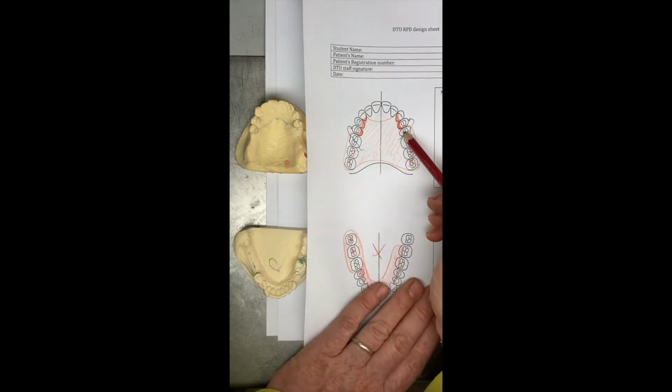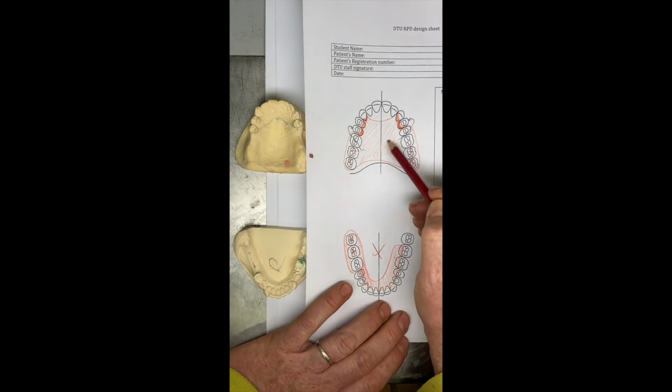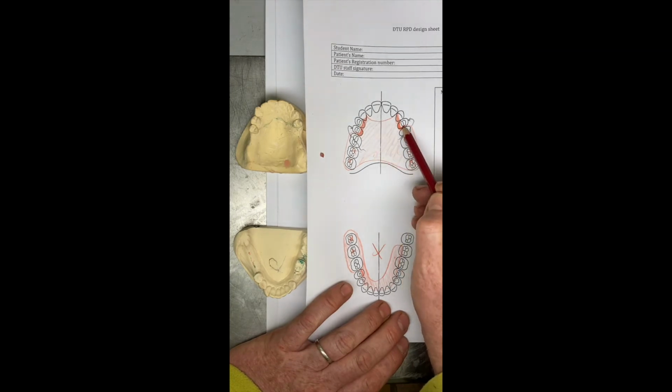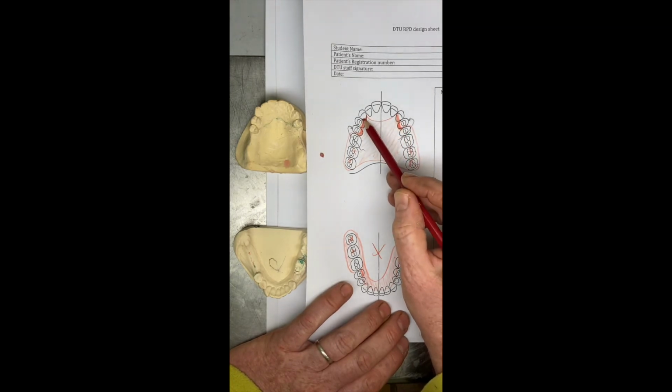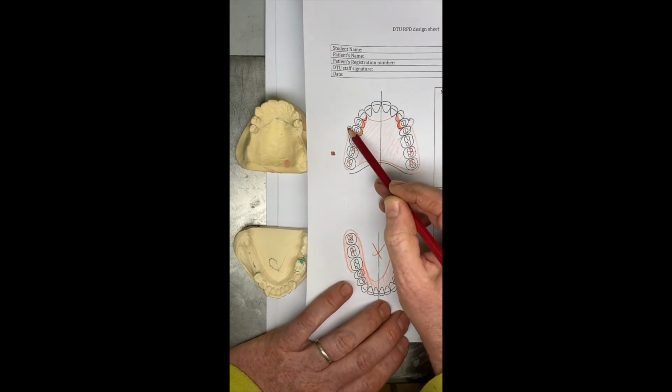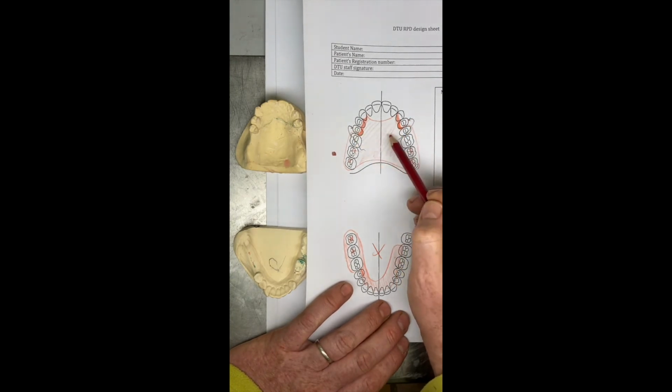The differences really are that the support would be gained from the footprint of the denture. The connector would come up to and above the survey line on each of these abutment teeth to get a degree of support and get a good fit between the denture and those abutment teeth, and to provide some bracing. And then we could still have clasps onto these abutment teeth, these premolars as well, just wrought clasps. Or you could have cast cobalt chrome ones incorporated if you wished, and these can be stainless steel.